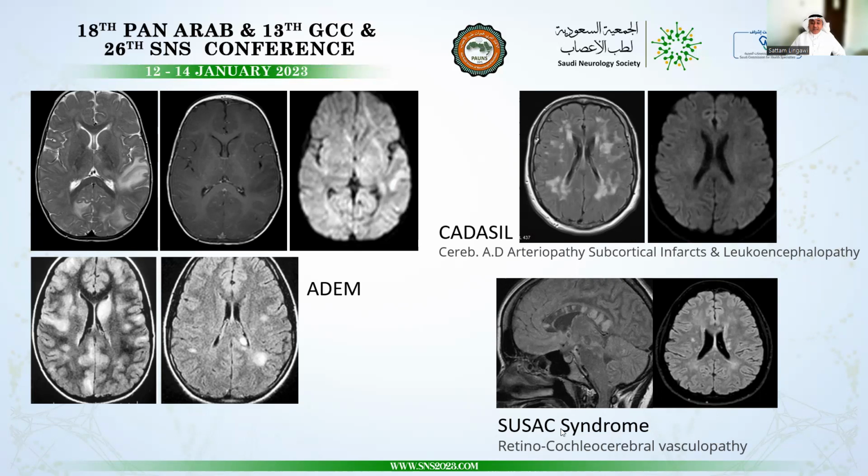Susac syndrome has the classic syndrome with visual and auditory impairments, and classically involves the corpus callosum with large cotton ball lesions involving the body of the corpus callosum and the splenium. These lesions are within the center of the corpus callosum and do not classically involve the undersurface, which is often seen in MS.